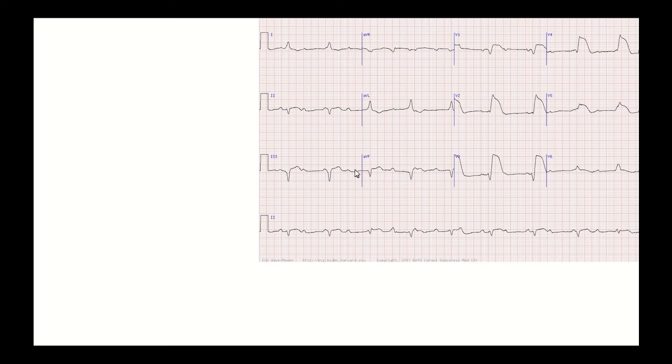That's one possibility. The other is that the ST elevation could cause ischemia of the AV node that can either transiently or permanently disable it. Now, normally the AV node gets a dual blood supply from both the anterior and the inferior circulation, but sometimes that doesn't happen. Sometimes the LAD actually wraps around the apex to supply the PDA. Sometimes the left main and left circ are dominant, the right is very small, and so a left main lesion could do something like this. So you've got several different potential explanations.